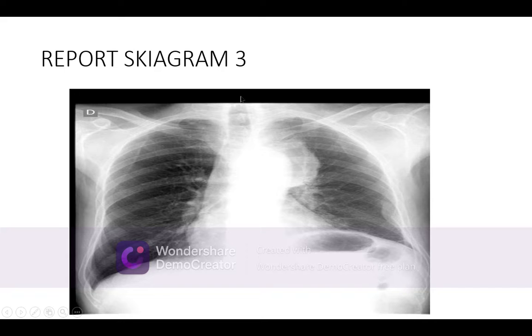And afterwards I will say the trachea is central in position. The lung fields are divided by the second costal cartilage, one line is drawn, and by the fourth rib, one line is drawn. So there will be upper, middle and lower zones. There are 6 lung fields.